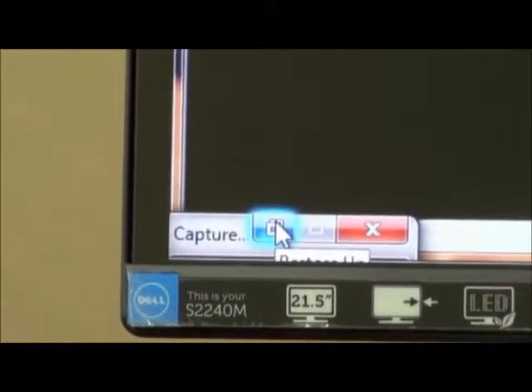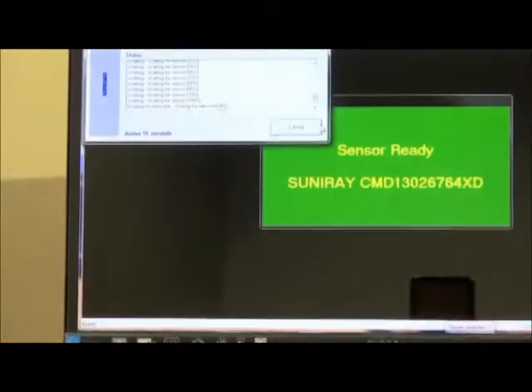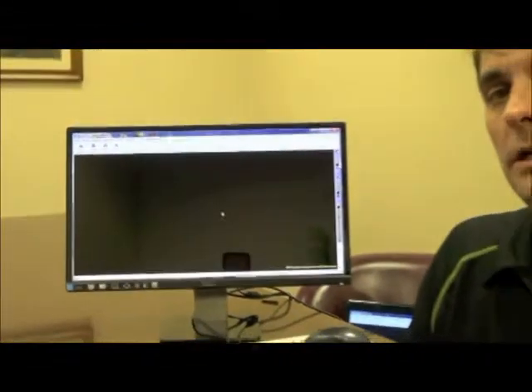Click on the first Restore Up button, and it'll bring it here where you have the opportunity to click cancel and cancel the x-ray. So now, you'll see sensor capture canceled by the user. So that's an individual x-ray.